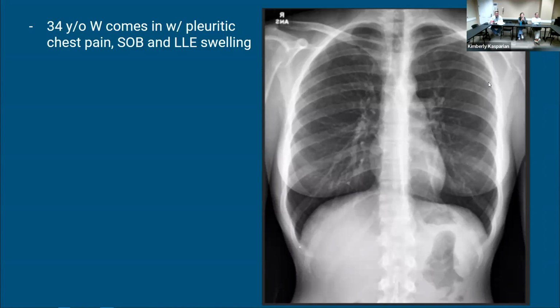So technical quality, I see what I need to see through the cardiac silhouette with vertebral bodies. Airways midline with a good trachea. B, bones look okay, clavicles, ribs. C, cardiac silhouette is not enlarged, doesn't have a big wide mediastinum. Diaphragms seem low in the chest, maybe a little hyperinflated, but with clear costophrenic angles. And then lung spaces look clear, no big infiltrates or big blown out things.